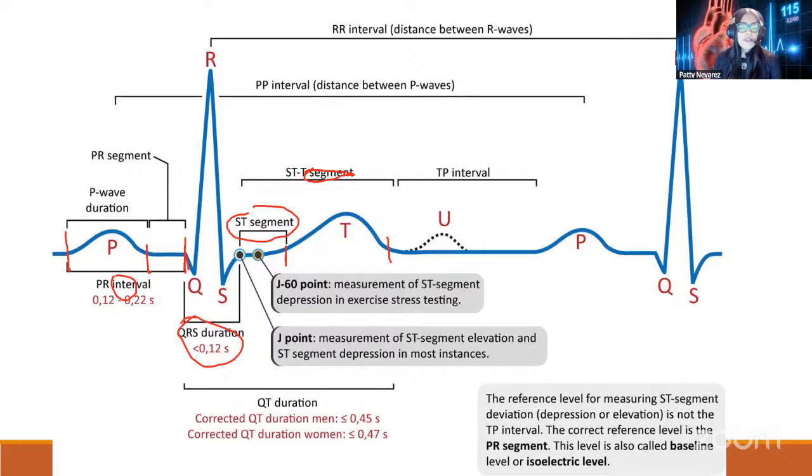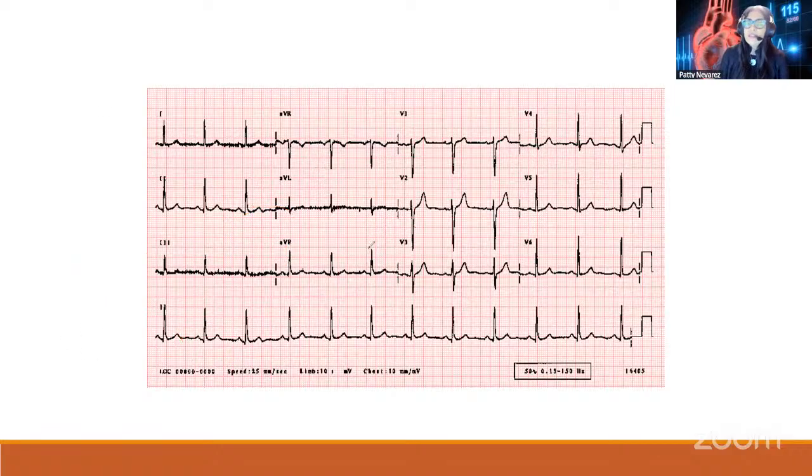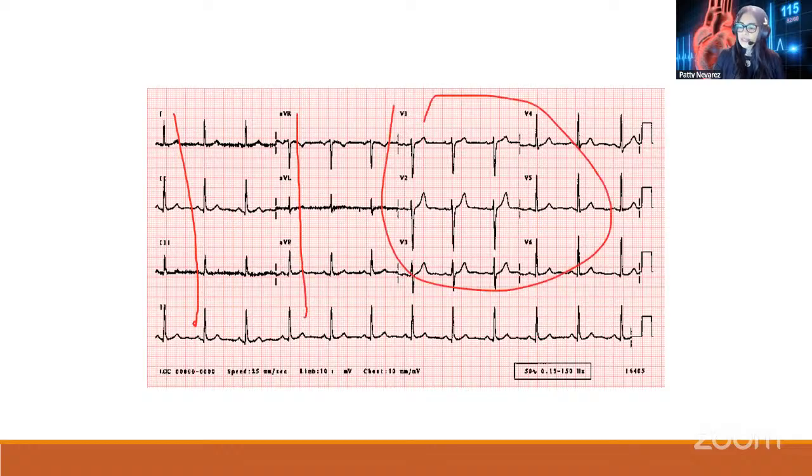Okay, so why is it important that we know EKGs? What is this telling us? Well, I guess I need to clear all this. What do I need an EKG for? What is it telling me? Remember that we said that the electrodes, the leads, are sending information. They're sending the report from different views. Okay, so each one of these, I want you to remember this table here, leads 1, 2, 3 on this side, the augmented voltage here, and then the precordial leads on this side.